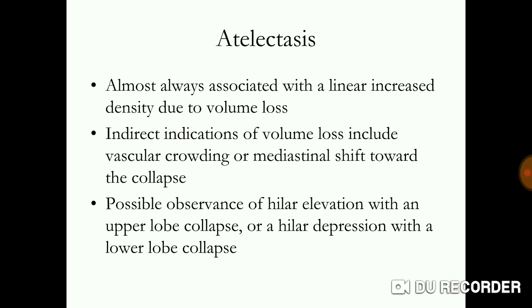Next is atelectasis, almost always associated with a linear increased density due to volume loss. Indirect indications of volume loss include vascular crowding or mediastinal shift towards the collapse. Possible observance of hilar elevation with an upper lobe collapse or hilar depression with a lower lobe collapse.